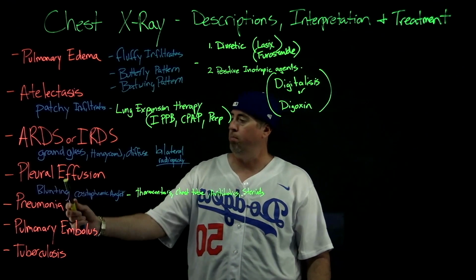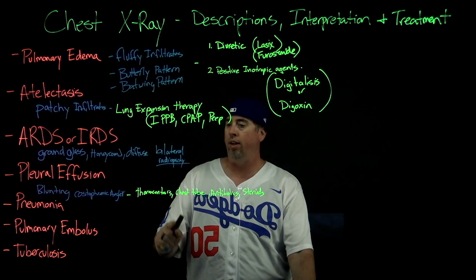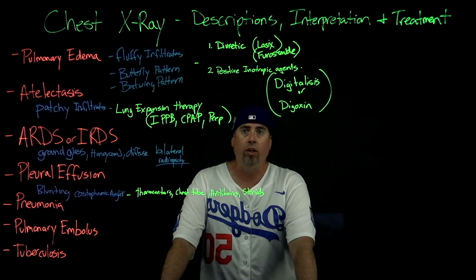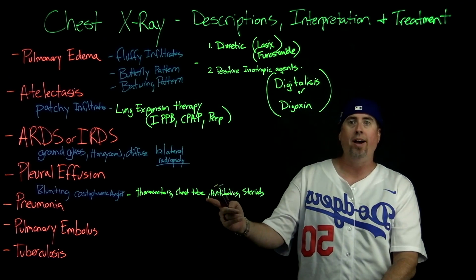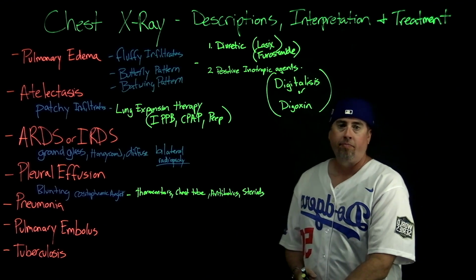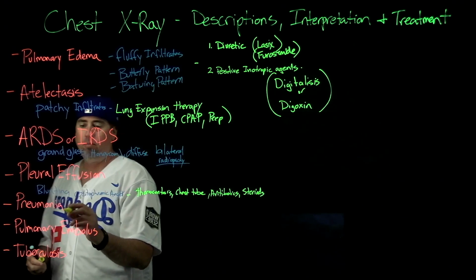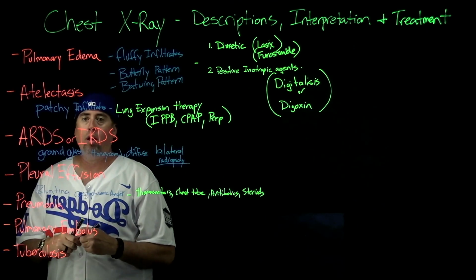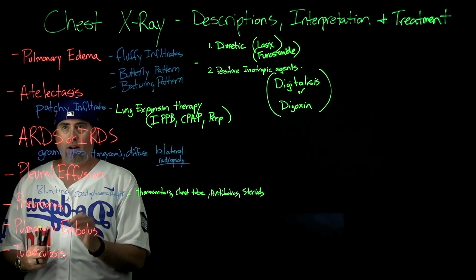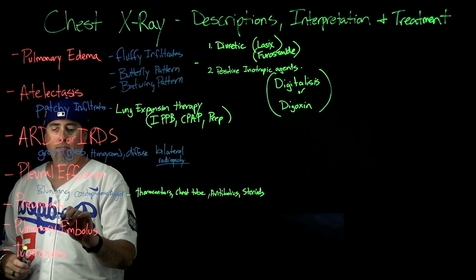All right. So, pleural effusion, blunting of the costophrenic angles, right? You know you're leading down to some type of fluid that's going in there. What should we do? Well, recommend a thoracentesis, most common. We can also do a chest tube or antibiotics or, obviously, put some steroids for inflammation, okay? All right? And the next one on the list is pneumonia. And on pneumonia, guys, what are we looking for? What do you think? Okay, this one's very, very specific, guys. This one is air bronchogram.